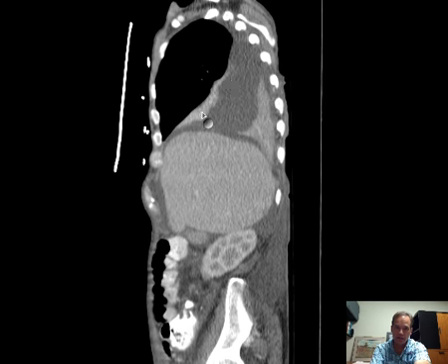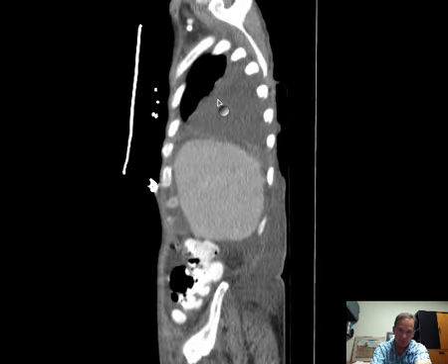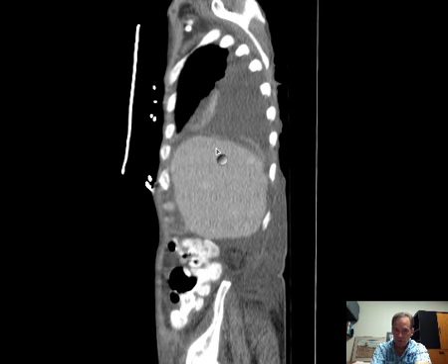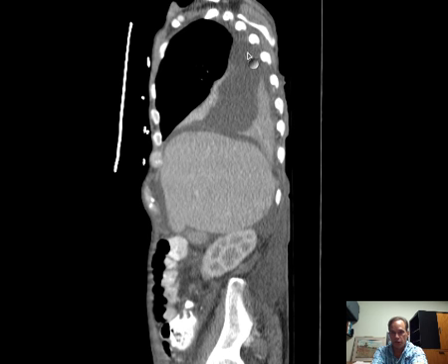So we have atelectasis of the right middle lobe, which I would say is complete, and if you follow it out laterally, you'll see that it does dissociate from the right upper lobe with a fissure, or a fissure that divides the right upper lobe from the right middle lobe. And of course, the major fissure, which ordinarily divides the lower lobe from the right middle lobe and right upper lobe, here is a capacious fluid-filled space.